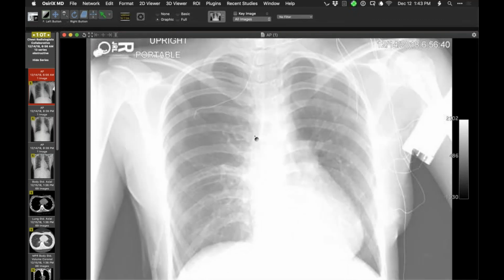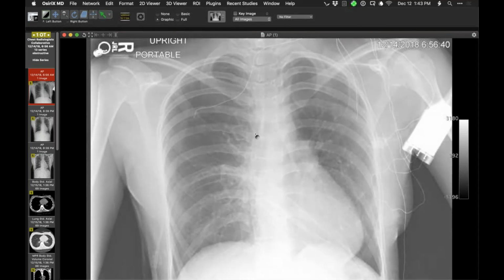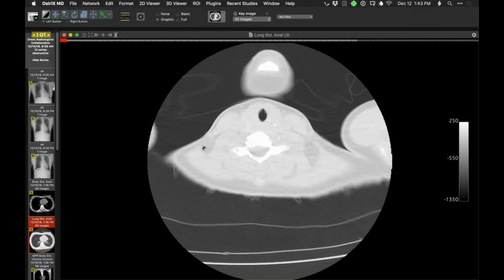But if you look at the lungs now and look at the vessels, they are simply not normal. They appear to be small. In some areas up here, they appear to be particularly small. These vessels here again are not normal. Some appear to be quite attenuated. And it's the kind of case where the more you look, the more the vessels seem abnormal in terms of their caliber, their branching pattern perhaps, and seem to be asymmetric, perhaps left versus right. So something's wrong.